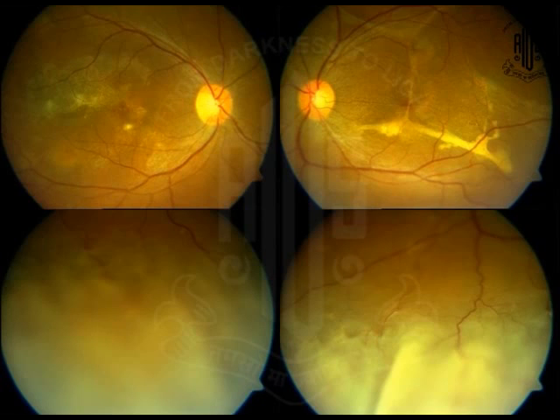And here, one of the color photos, you can see this huge inferior detachment with already bad posterior pole with subretinal fibrosis. And this is another one of the chronic CSR. If we see the big area of posterior pole RP changes, window defects, and few of the active leaks still present.